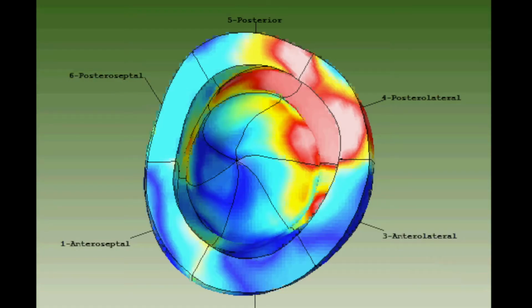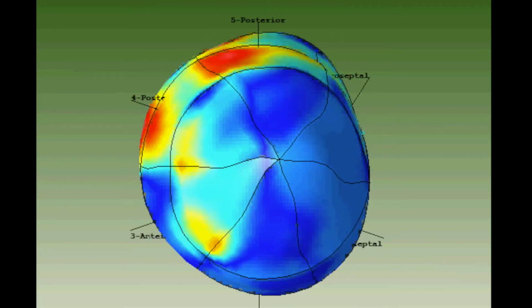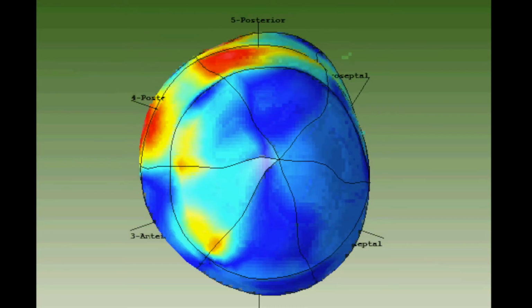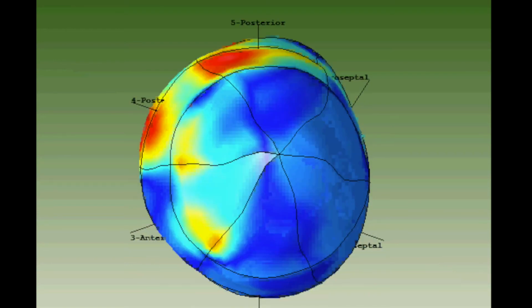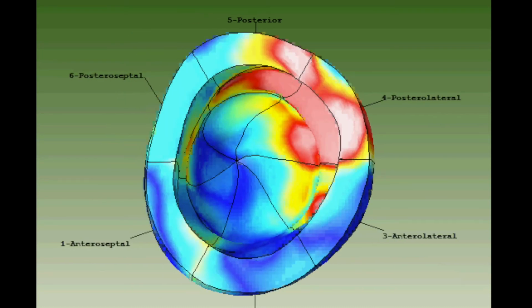We can assess a patient to evaluate the microregional contractile function. In this patient, we can see an extensive region of poorly functioning myocardium, or heart muscle, in the posterior area of the left ventricle, where there are 2 areas of red demonstrating greater than 2 standard deviations from normal through the cardiac cycle. This quantitative assessment of microregional cardiac function indicates viable and non-viable myocardium to guide surgeons to more timely intervention, a key to survival for the patient.